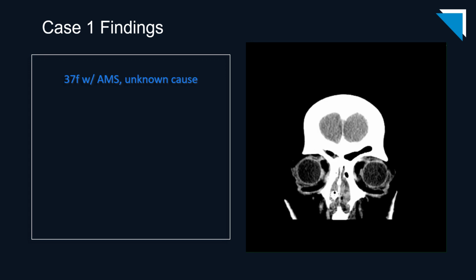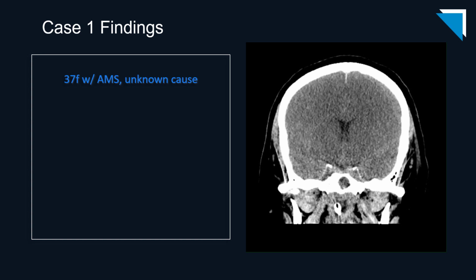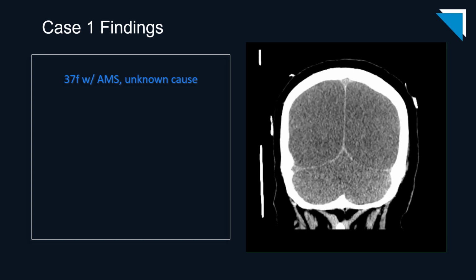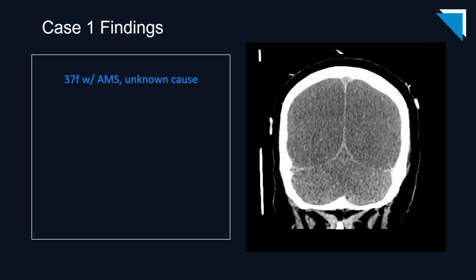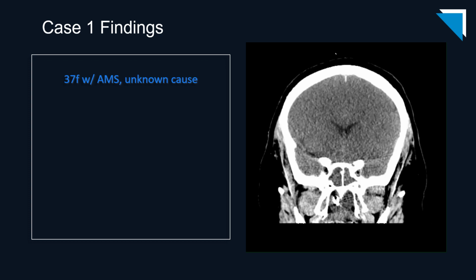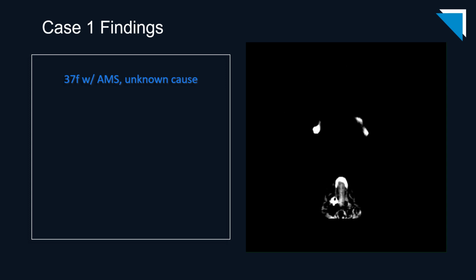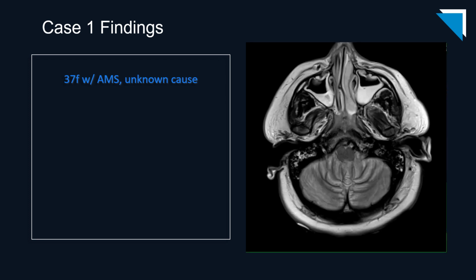Here are the coronal images from the same study. We don't always have a corresponding MRI, but we do in this case.